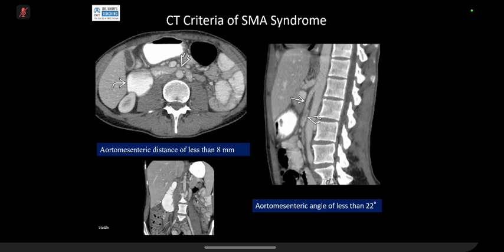If you look here, now this is abdominal aorta. Sorry for those of you who are online, but I am showing to the face-to-face people. This is aorta, this is SMA. Now, this is the angle, for example, and the D3 is passing through this, right? Now there is no fat, and it becomes like this. Nutcracker, nutcracker. Now D3 is compressed. Because it is a vessel, it is not causing absolute obstruction, but it is causing chronic type of symptoms.